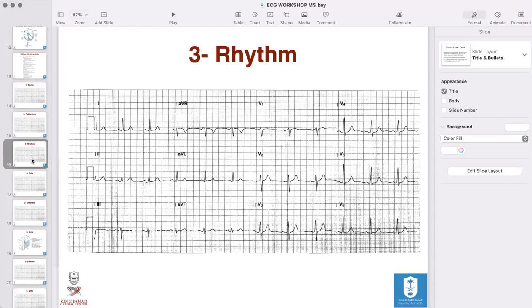After you identify this is sinus rhythm, and that's the case here, then you check the rate. For rate measurement, there are different ways, probably 3 methods to do that. I don't care about how it's done, but usually it's calculated by the computer, and it's pretty reliable. But if not the case, who can volunteer? What method are you going to try to calculate the rate?